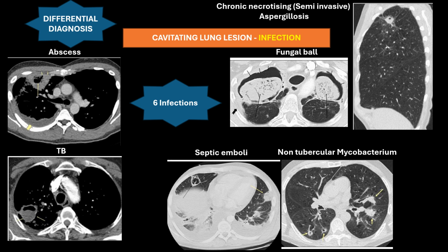This is the first important cause of cavity, that is infection. We would like to remember six infections in our day-to-day practice. One is abscess and tuberculosis. Both of them are going to have thick enhancing walls with air-fluid levels.